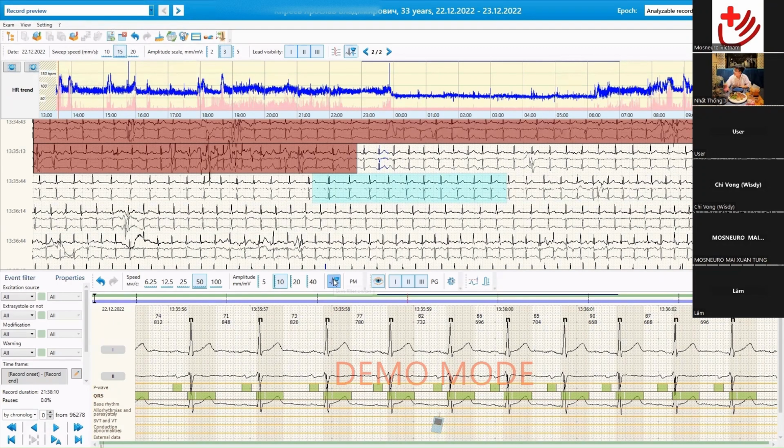Also here you can apply a drift filter or switch it off. Not a big deal, but you can hear that something changed now on the screen. You can also switch off some channels if you do not want to see them, or to focus on another channel.